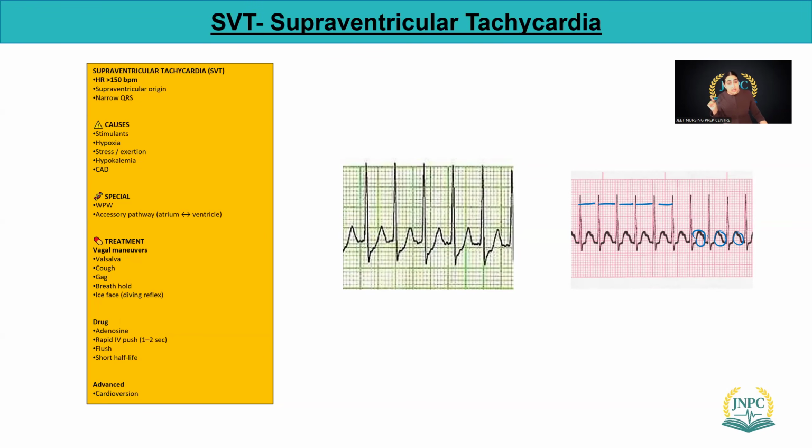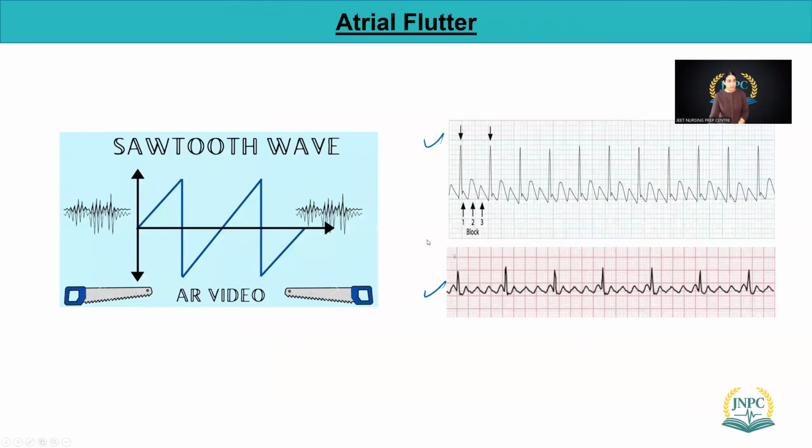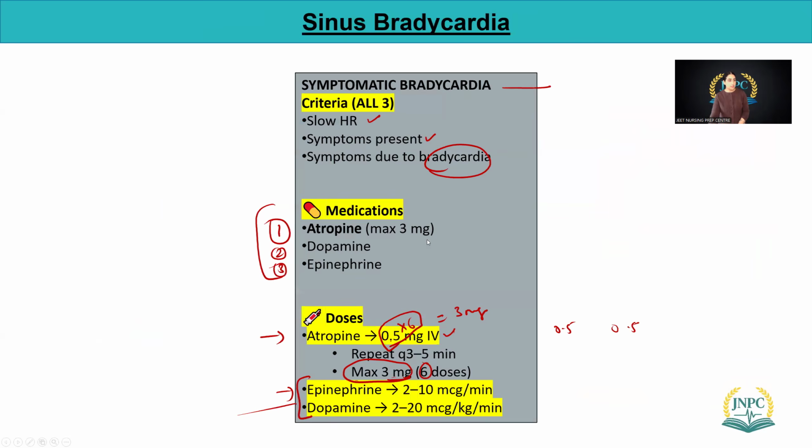But in sinus tachycardia, we can really look at the P wave and we can differentiate this is the T wave and now the P wave is coming, in QRST, QRST. But in supraventricular tachycardia, the T wave and P wave are blending together. We cannot really locate them. Okay, that is one thing. And the QRS complex. Think about that QRS complex. I told you in the starting, let's go back. What is the timing for the QRS complex?